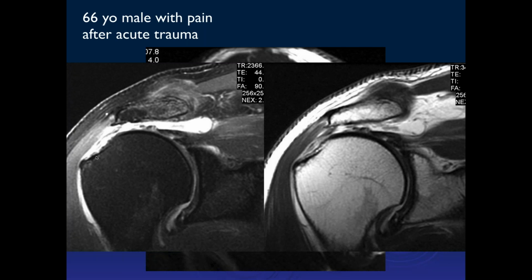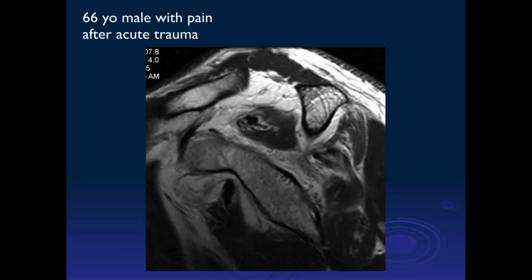So if you have an acute tear like this one was, and you get proximal retraction of the musculotendinous junction, and if the plane you're looking at is right through here, what will happen is you may not have significant atrophy of the muscle. You may have a quite normal muscle, and in an athlete it may be a hypernormal muscle. But what you have is retraction of the muscle, so you get a positive tangent sign even though you do not have any atrophy of the muscle.